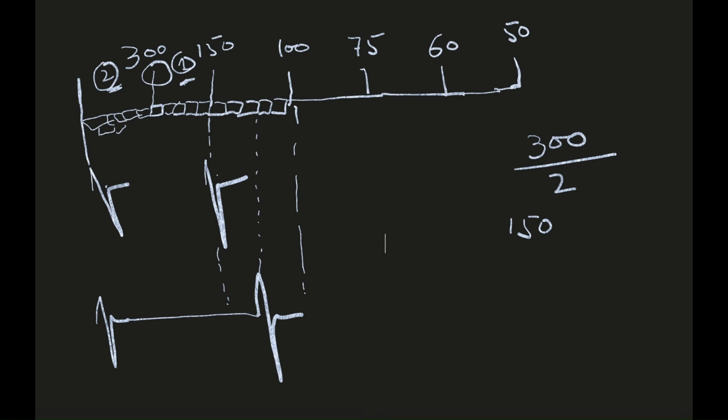Now, calculate the smallest squares between the 150 and 100 milestones. There are 5. And how many heartbeats are there between 150 and 100? There are 50 heartbeats. So each smallest square will be holding 10 beats.